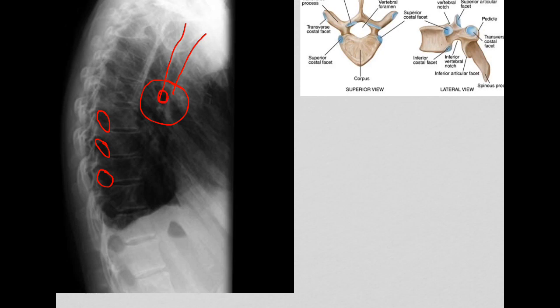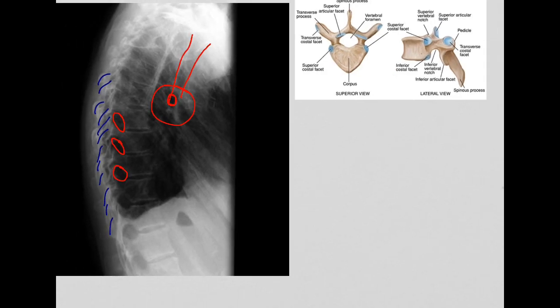We can see the retrocardial space here. All of this area back here becomes really, really difficult to tell what's what because of all of the posterior rib margins. But it is a good indication of rotation. If you have more than a half of an inch of difference between the margins of the posterior ribs instead of them being directly superimposed, then you've got too much rotation. A little bit of lack of superimposition is perfectly acceptable because of OID magnification.